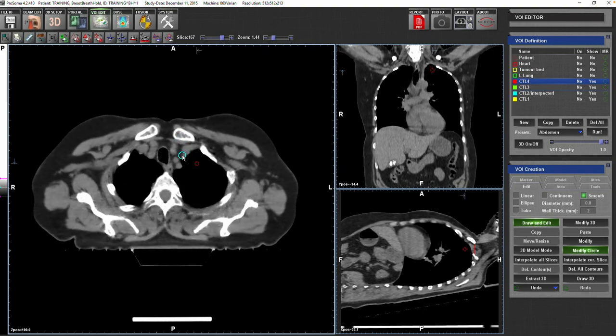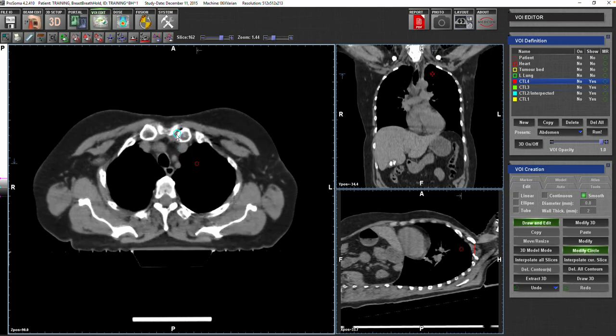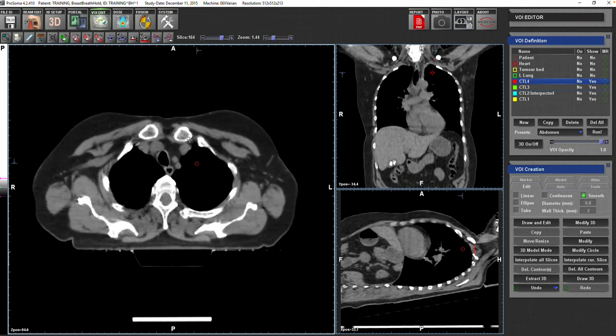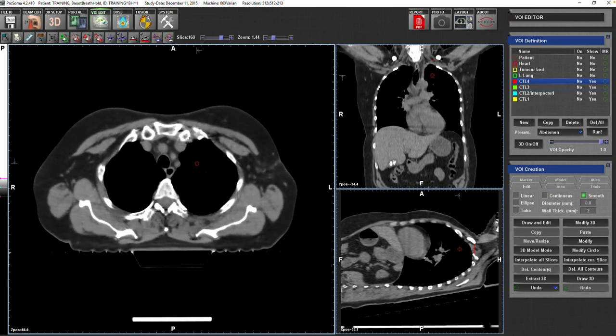So we know that at the sternoclavicular joint, usually we put the lower border of the supraclav field just below the sternoclavicular head, isn't it? So if you go to the sternoclavicular head, and you draw your target like that, just around the vessels that you can see clearly. This is what we call the three branches of the vessels of the arch of the aorta.